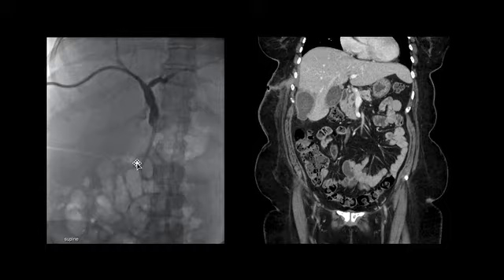And so this drain was removed, and this is a CT scan with a coronal image at the level of the drain, showing this hematoma that I talked to you earlier about, leading to the contour deformity on the HIDA scan. And then we see this tract of the prior catheter placement with granulation tissue, and this was the site of the small volume of bile leak that we saw earlier on the HIDA scan.